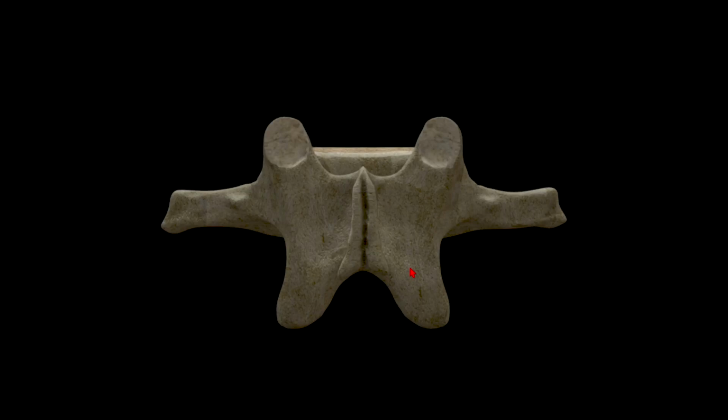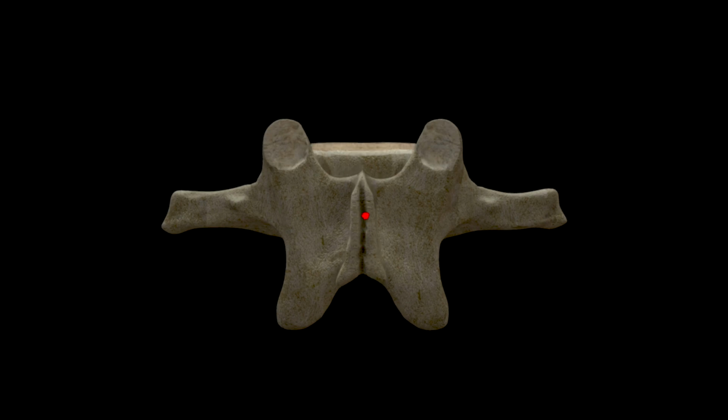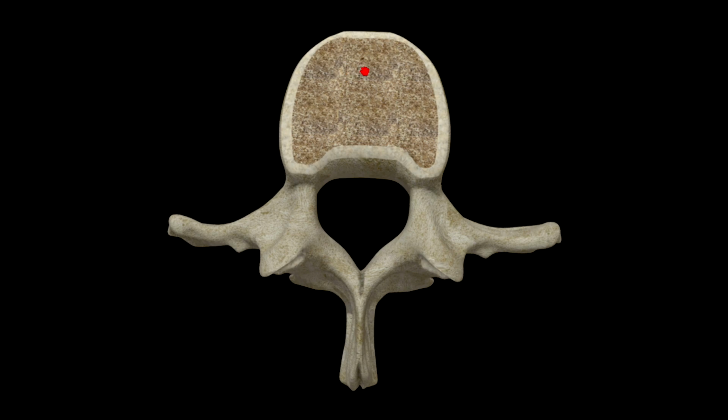In this longer video, I'll revisit the major parts of the lumbar spine, and I'll also overlay this on an oblique L-spine x-ray. First, here's the body again. That's the body of the lumbar spine. This bit of bone that juts off to the side, that's a transverse process. And the bit of bone that connects the body with the transverse process, that's the pedicle right here.